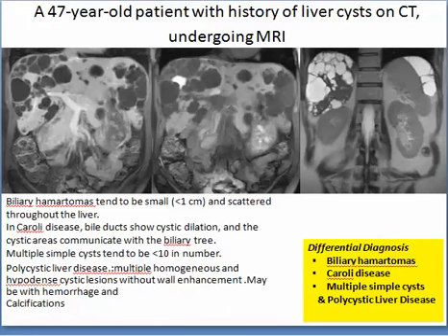Now here in this case, this is a 47-year-old patient with history of liver cysts on CT and underwent MRI.